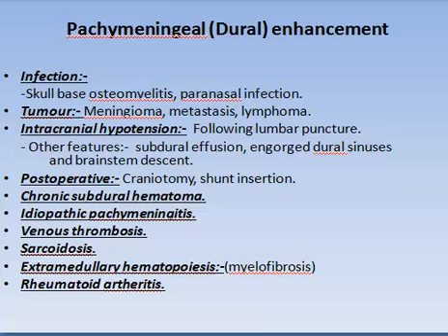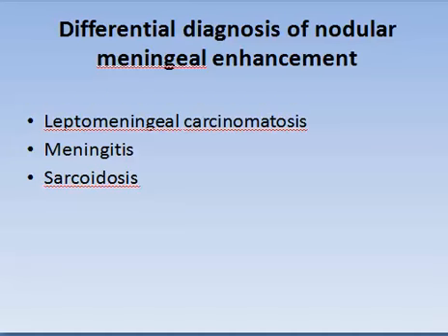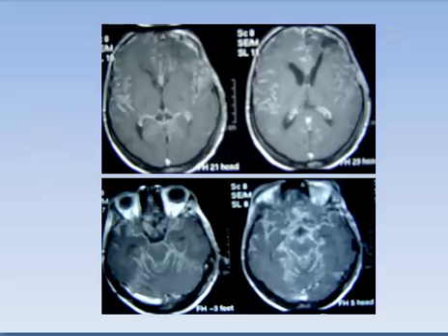Pachymeningeal or dural enhancement, again due to a long list including infections, tumors, intracranial hypotension, and many other conditions. Differential diagnosis of nodular meningeal enhancement is carcinomatosis, meningitis, and sarcoid.